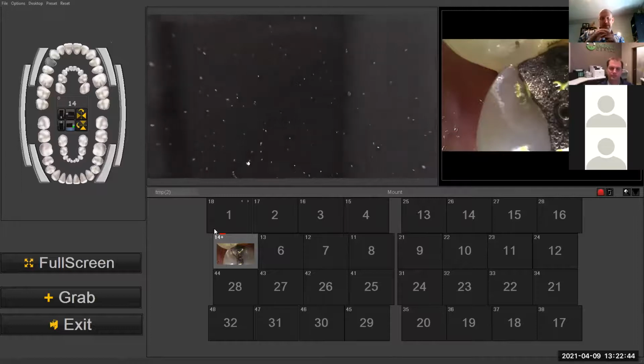It's a USB. It's an easy connection. Or you can use the buttons on the camera. From our experience, the buttons on the camera tend to be favored, but you have the two options.